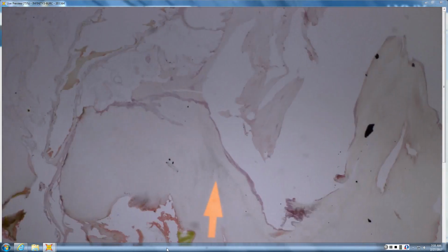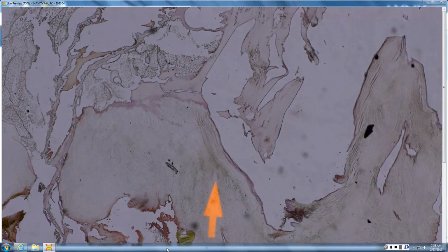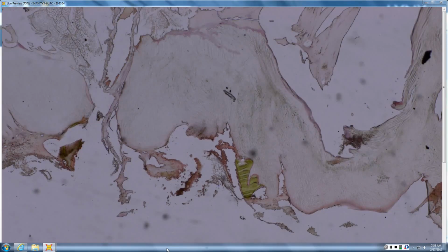So it kind of looks like a botfly. Yeah, exactly. So you see the little setae. We're seeing a thick chitinous wall, and you're seeing these little short brown angulated hairs, or setae, that anchor the organism into the flesh. And so that tells you it's a botfly. Myiasis, correct.